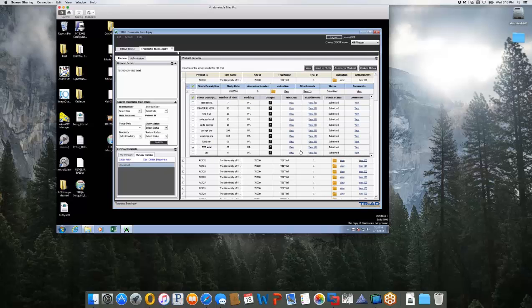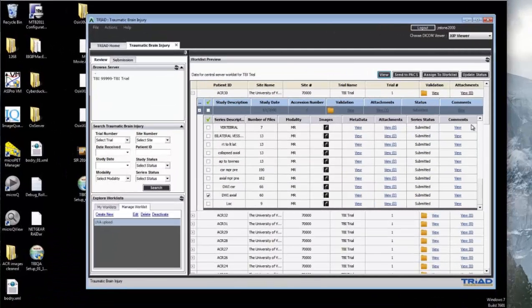So now we can select the same studies that I opened from Princeton, and then you can click on View on the top. And the prototype is going to load the data itself as well as the file. So Dr. Stone is going to be able to look at my findings and the report that I had and build upon it.